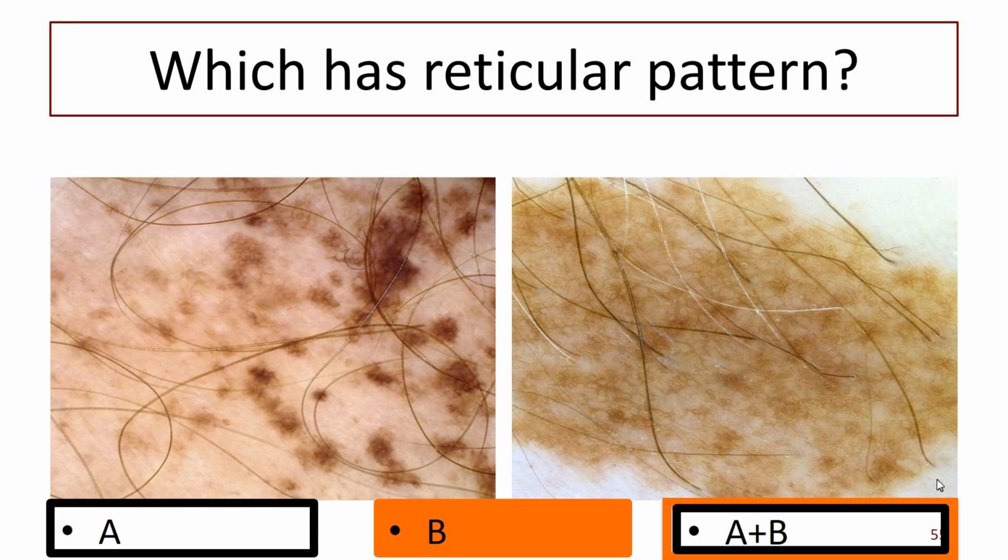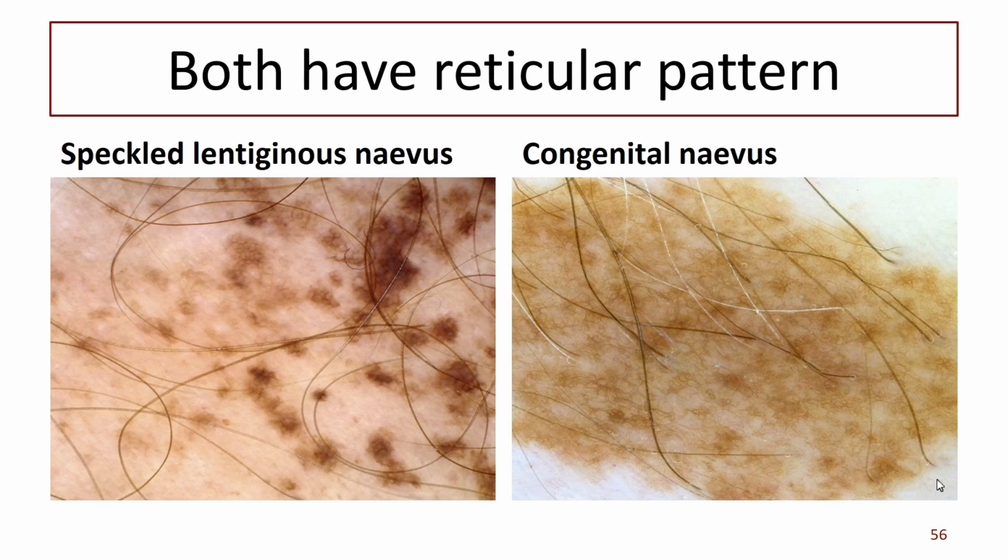That's right. So not dots, but lines. So intersecting lines. Hope everyone can see them. If you're having difficulty at the back, there's plenty of chairs at the front. So this one is more of a repeating pattern. If your eyes aren't very good, you might just see brown pigment. Probably doesn't matter. The main thing to note is that that pattern is the same all over. And that pattern is not quite the same all over, but basically the brown bits, this brown bit is pretty similar to that brown bit. That brown bit's bigger, but it's really got the same pattern. So both of them are benign.